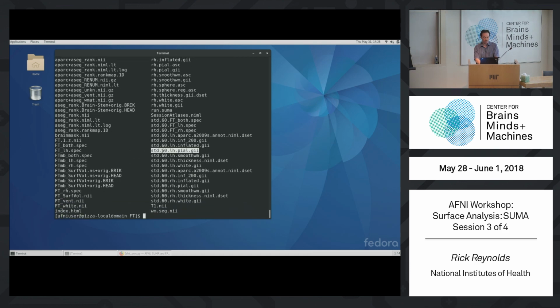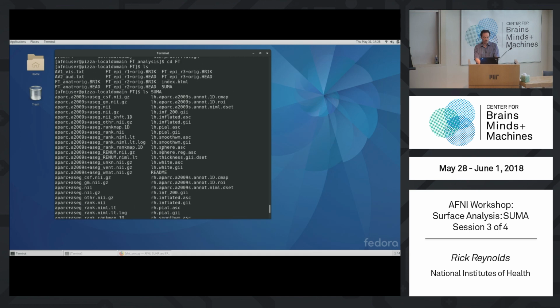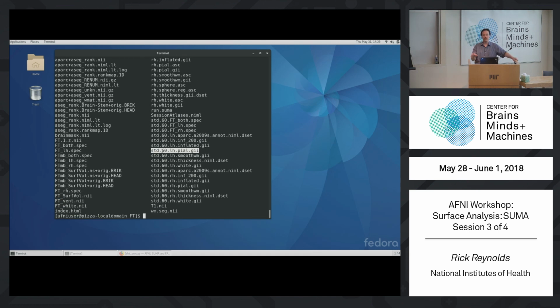And then we've got the standard mesh 60s. Do we have any others? I guess I didn't copy the other ones, we usually make 60. So the icosahedron has 20 sides, like a big die, that might basically match a sphere. And that gets projected to the sphere when we do the mapping. The 60 is like an oversampling of the edge side. You take this one giant triangle and oversample it 60 times, so you get little triangles. That's what this 60 means.